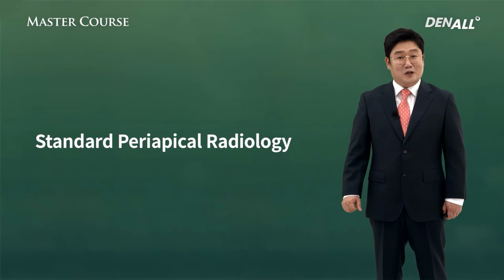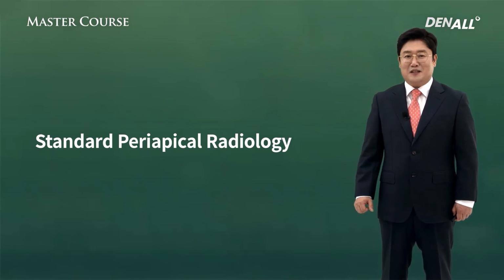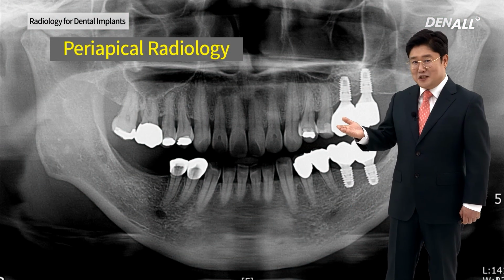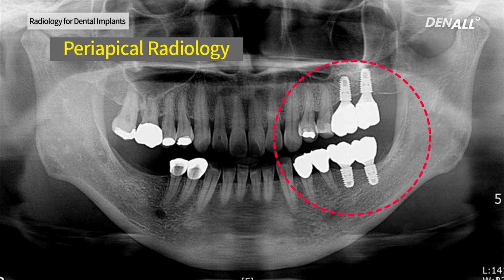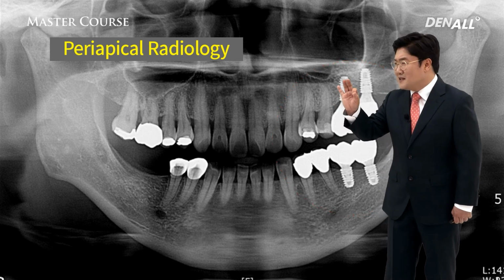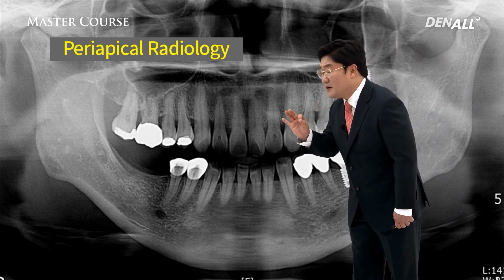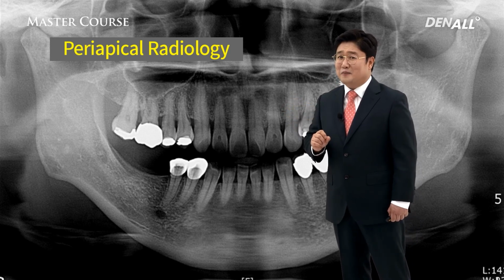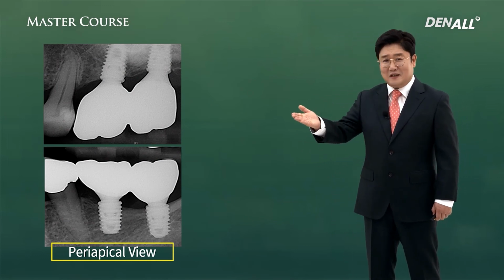Lastly, standard radiology or standard periapical radiology. Panorama X-ray picture. At the upper and lower left posterior areas, implants were placed. If you want to look at in more details, panorama is not quite sufficient. In that case, periapical X-ray can be taken, periapical views.